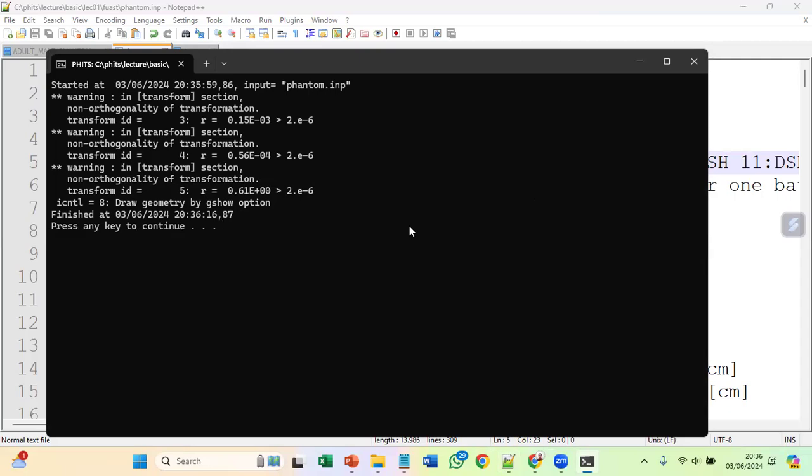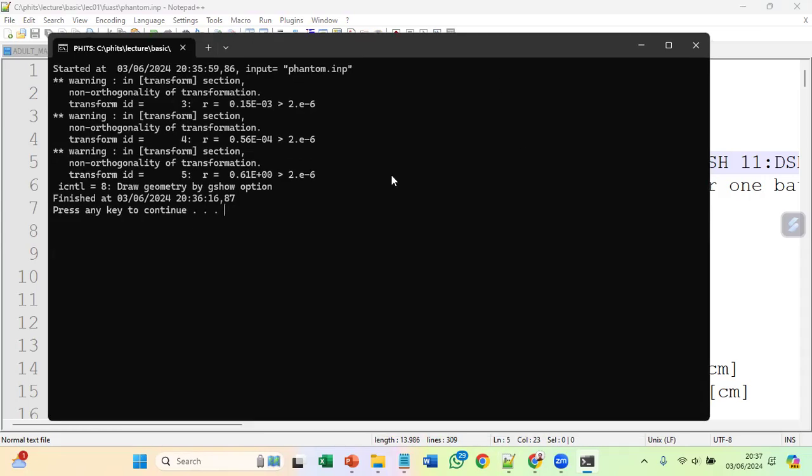You just did it five minutes ago in the phantom input. You replaced it, sir. Yes, I think after selecting it, delete.